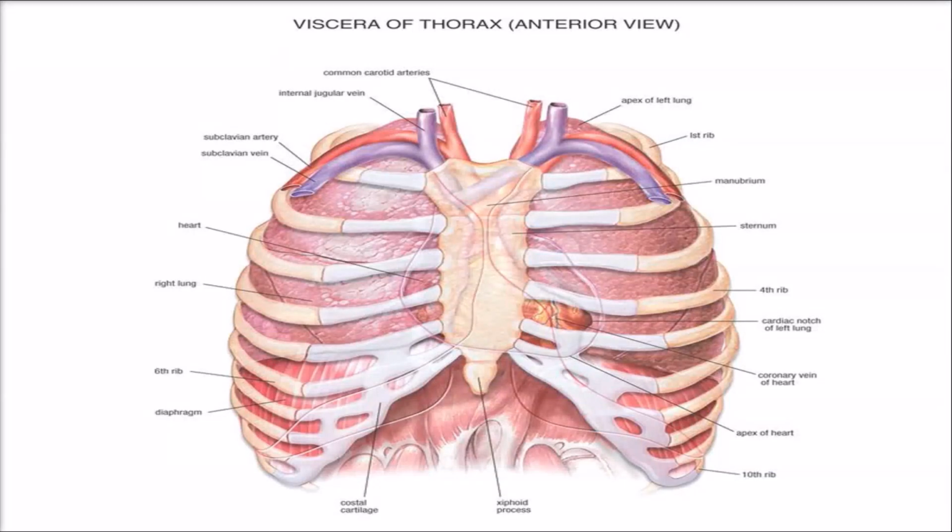We are here to make you more skilled in learning and reading a chest X-ray. Surely this would help you to become a wise observer. This video series begins with the basic anatomy of structures in the mediastinum and thoracic cavity.